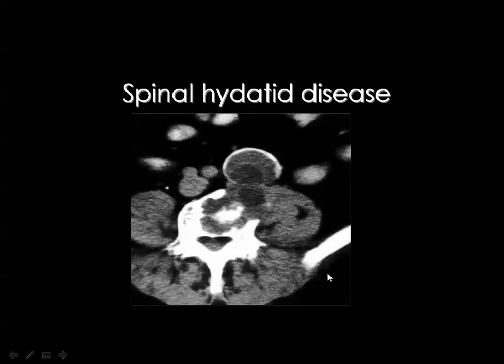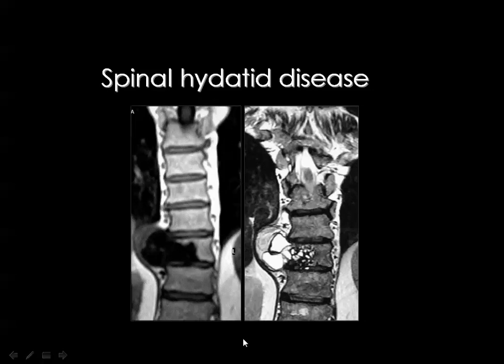But if you look at this particular lesion and you see there is erosion of the vertebral body, and there is a prevertebral soft tissue component which is partly cystic and partly solid, with marginal calcification, you may think that this is inflammatory, and you may also think that this is neoplastic, and sometimes we need to biopsy a lesion like this to confirm its nature.